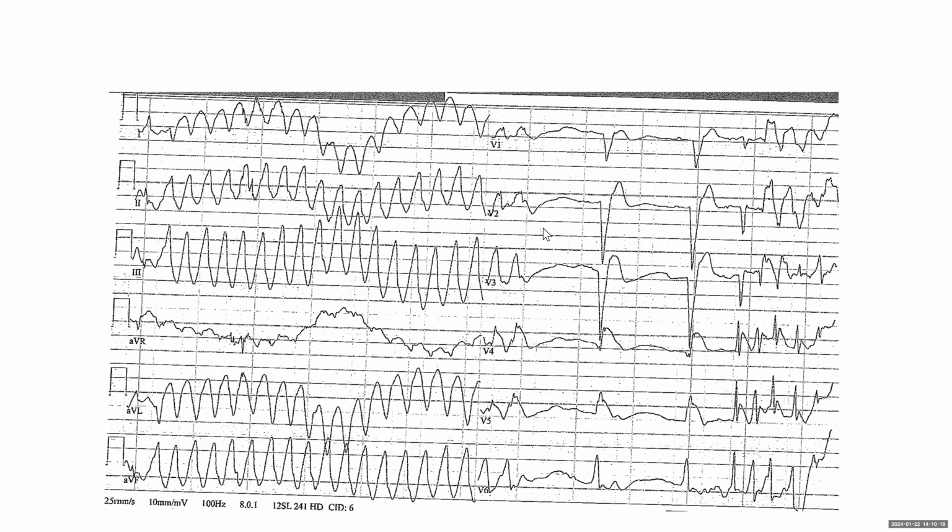But for the wide QRS, we often miss that. Although usually ischemia is a cause of long QT, but not always. Because the beat is following VT, we cannot comment. Definitely during VT you cannot comment. You only have 2 beats of sinus rhythm, so hard to comment. That's also very true. So you don't have a stable RR.